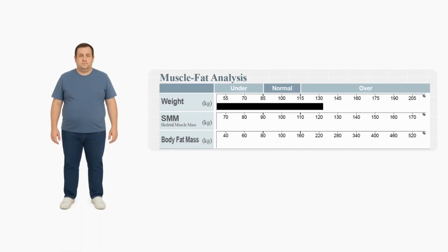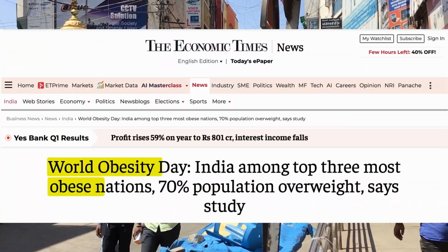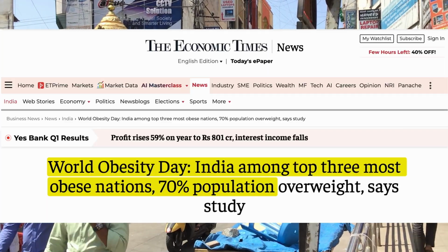If the weight of the individual is a little high, muscle mass is less, and body fat is high, then the graph which will be formed is a C-shaped graph. This is called a cautionary graph. This is the most common type of graphs which we see in the Indian population. In this case, a precaution has to be taken that muscle mass has to increase and body fat has to decrease. The second type of graph is the I-shaped graph.